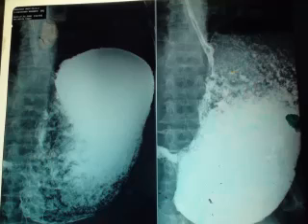The patient suffers from, as well as a history of duodenal ulcer, repeated vomiting and abdominal discomfort. We can find in some X-rays that the stomach can reach down to the pelvis.